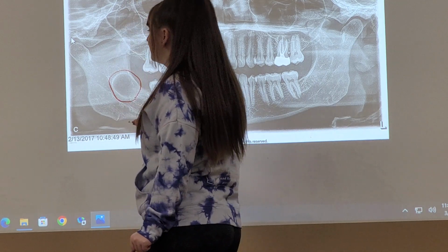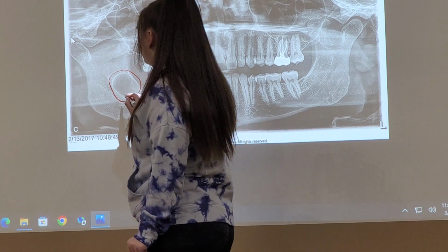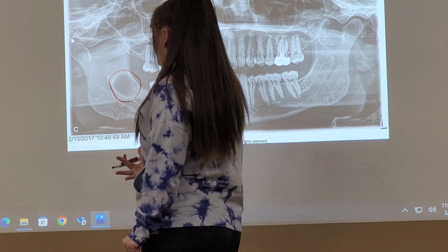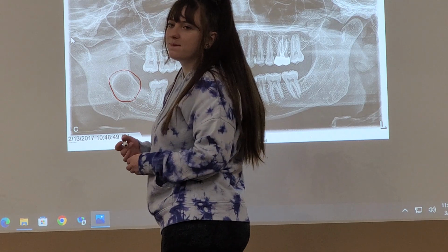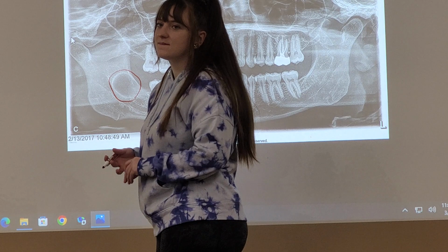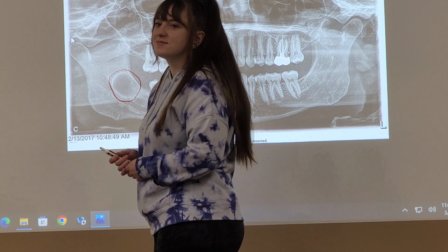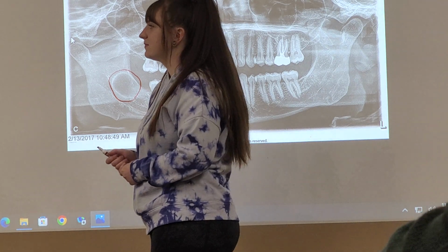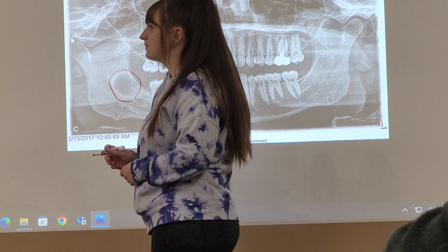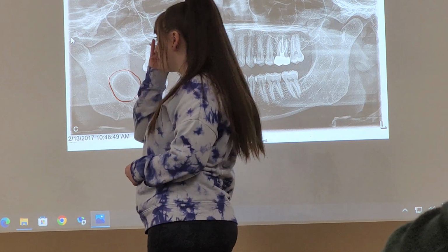Is it radiolucent or radiopaque? The inside is radiolucent. Okay. The ring is radiopaque, so it wouldn't be a target, right? Because it's flipped for a target lesion. A target is opaque in the middle and lucent around it. So how would you describe it?